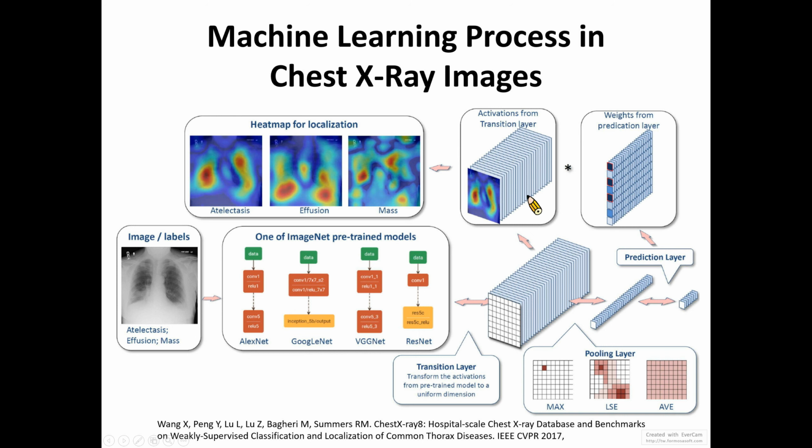Our goal is to use AlexNet to do the training. So here I divide the data by label into training and testing data. Then, using this small data set, we randomly show 20 sample images.